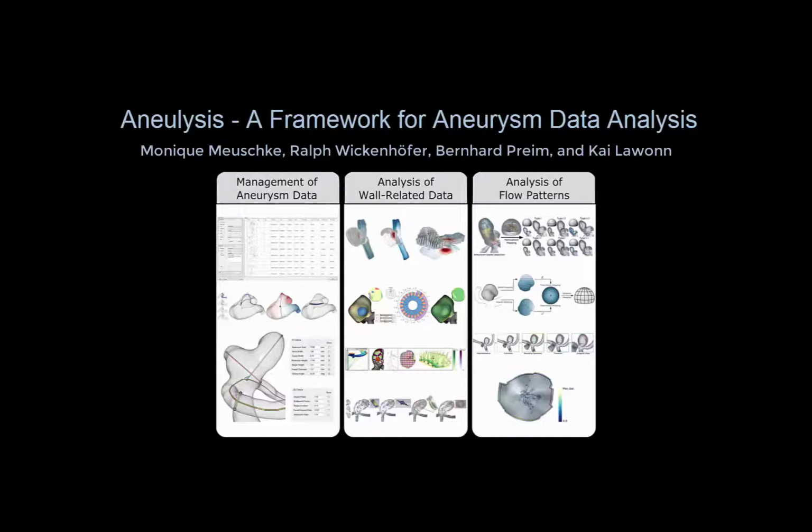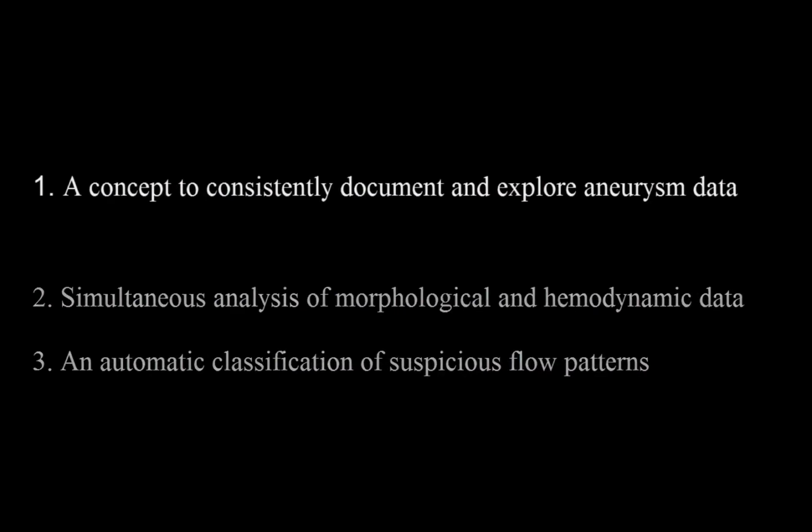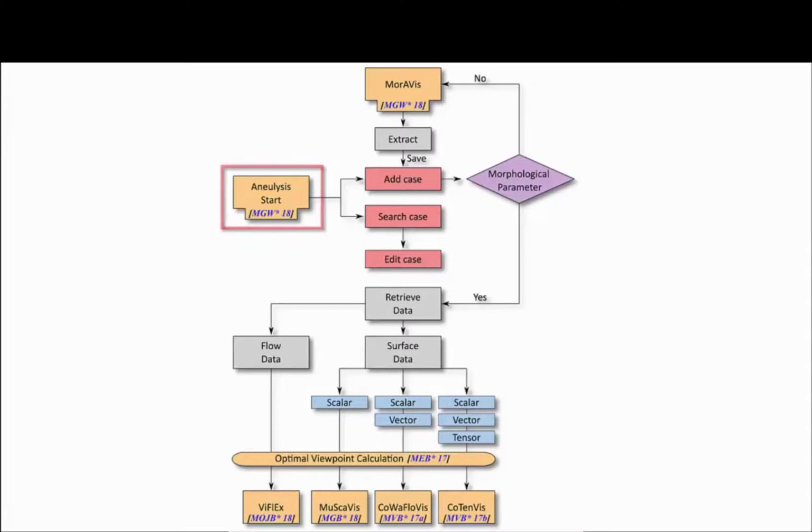We present Aneulysis, an interactive management and visualization framework to evaluate the rupture risk and treatment decisions of cerebral aneurysms. Aneulysis allows a consistent management and guided exploration of simulated aneurysm data. We provide a guided workflow where domain experts can analyze datasets collaboratively.